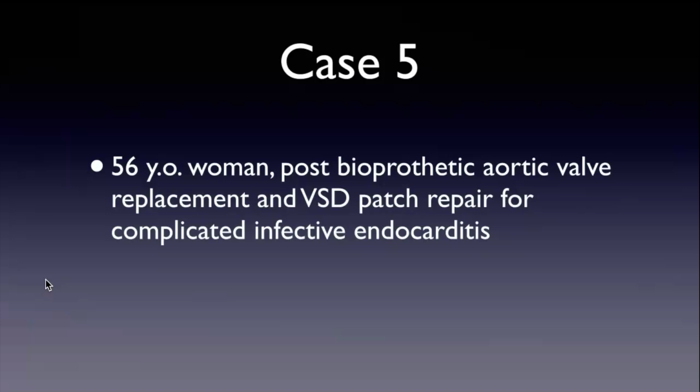When I read the stress echo, I thought it was LAD infarction. It's just very focal. It's at the very distal level. There wasn't a residual hypertrophy that I would have had my hat on for apical HCM with infarction. And the other thing is that I can't say for sure, but my sense is that the apical HCMs that have apical infarction have a lot of apical hypertrophy.